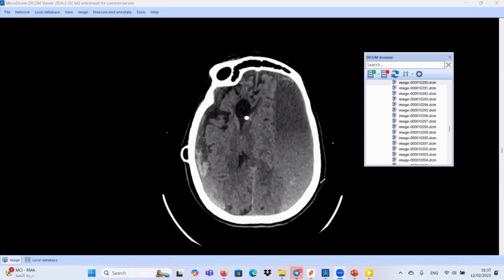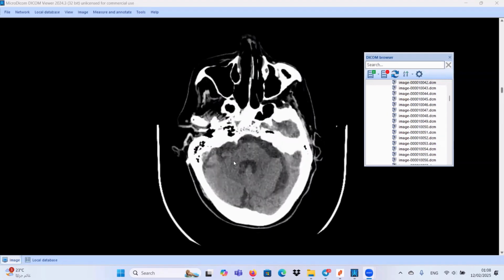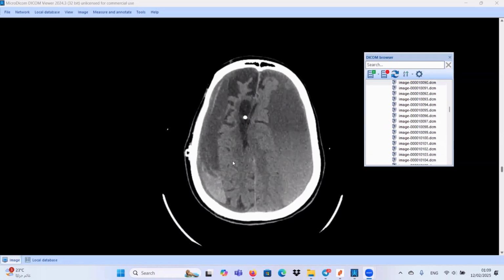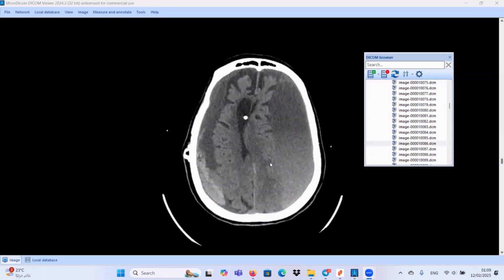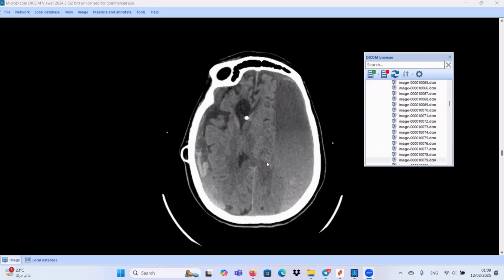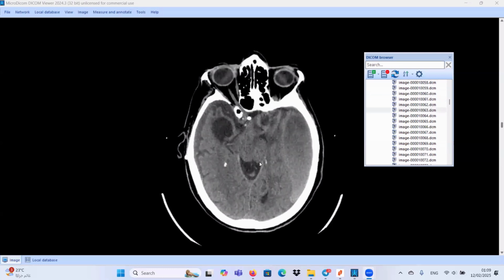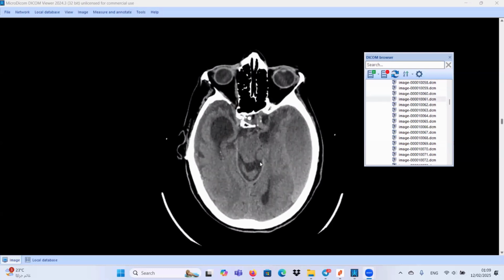This is our second case today. Non-contrast scan for an adult patient. As you can see with me, we have bilateral subdural collections crossing the sutures, larger on the left side. We have also midline shift, as you see at this level. Suspecting subfalcine herniation, we will identify this abnormality in the coronal plane. We have also, if we concentrate at this area, the site of the ambient cistern. It is totally obliterated. It is not clear. So let us concentrate at this region.